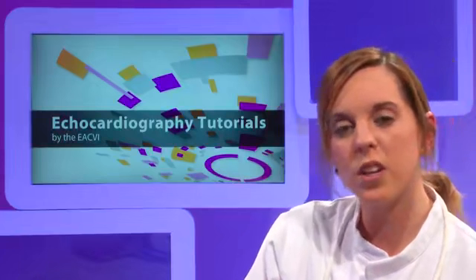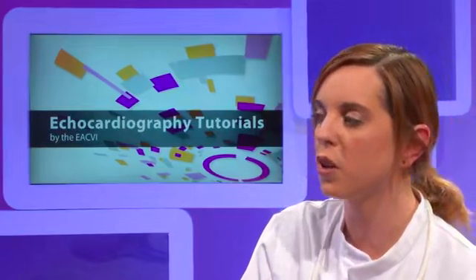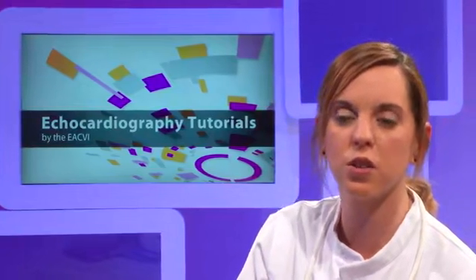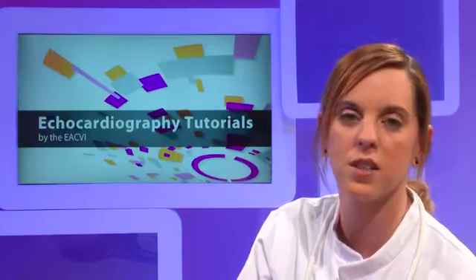These are the three cases I wanted to present to illustrate the pathological features that you can obtain when you assess a mechanical prosthesis. What are the take-home messages? First, when you assess a patient with a valve prosthesis, you need to know the type of prosthesis. You need to measure the blood pressure and to evaluate the body surface area.